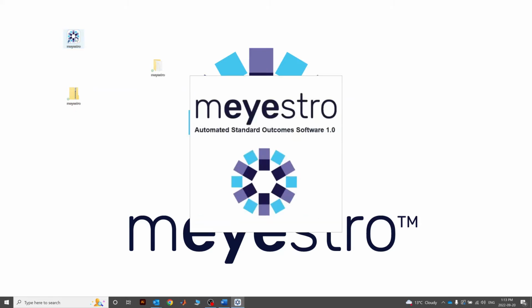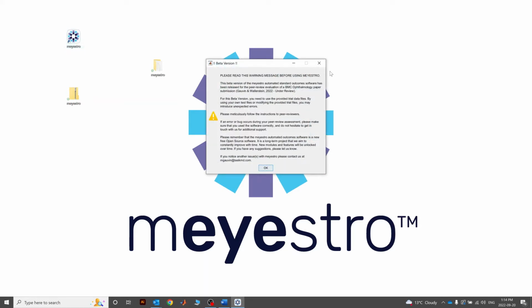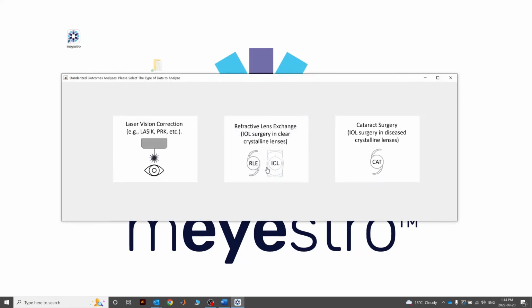Double-click on the mEYEstro desktop shortcut. mEYEstro will then start. Again, depending on your computer, this may take a few seconds. You can see the mEYEstro logo, which will soon automatically disappear, and a prompt with a warning message will then be displayed. Please read this prompt and accept it by clicking OK. And finally, we are at the main mEYEstro interface.